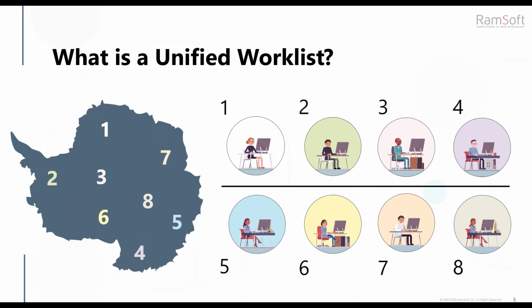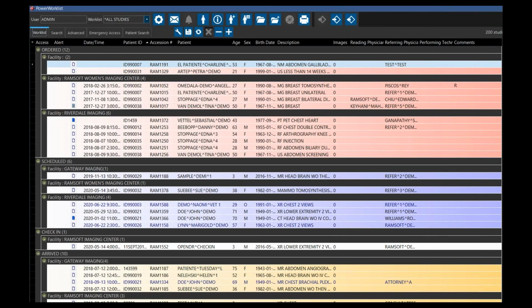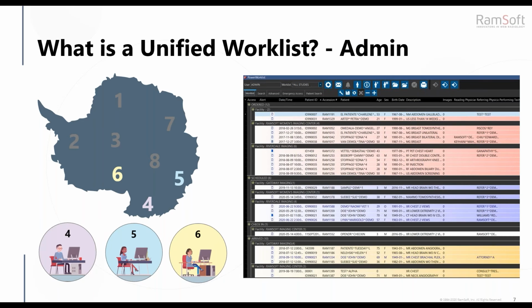Now, for instance, here's a screenshot of a worklist a practice manager might use. The practice manager is essentially going to be an admin, right? So that manager has access to all the different worklists. This gives them the ability to review departmental workflow, make adjustments to ensure the practice is running smoothly. They can also easily move tasks from one list to another, drag and drop.